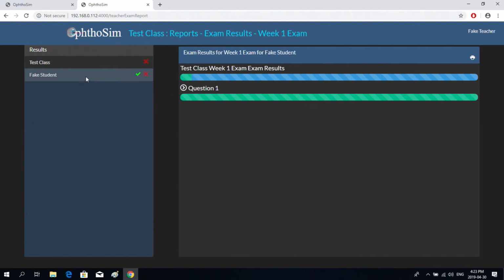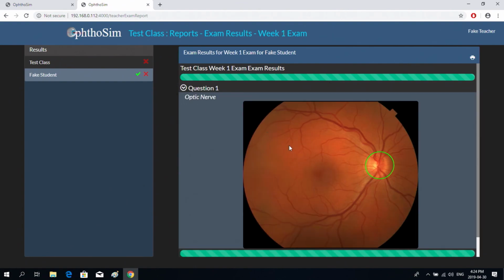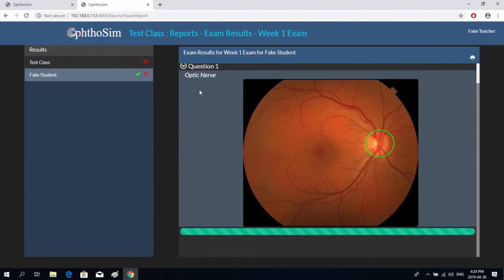And if I want to see what the student did, it'll be the same thing. You got 100%, the grade 100%, you got 1 out of 1 correct. Incorrect was 0 out of 1, and unanswered 0 out of 1. If I want to view the question, this is what the question was. The question was to identify the optic nerve, and the answer was correct. So this gives me a very powerful tool to look at in a very granular way how the student did on their exam and how they compare to the other students in their class as well. And I can print that out as well.